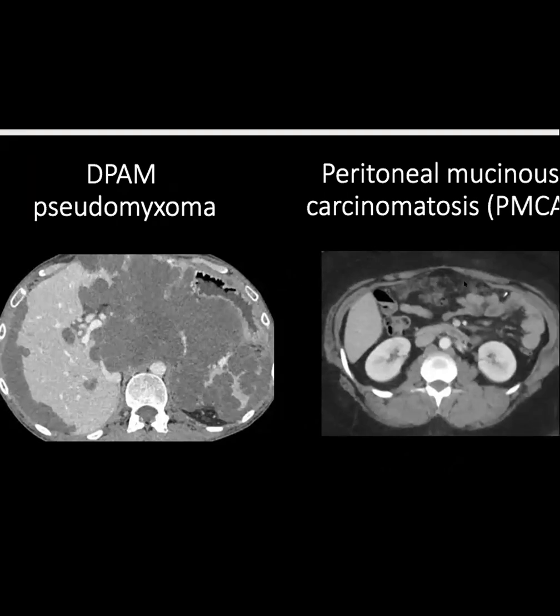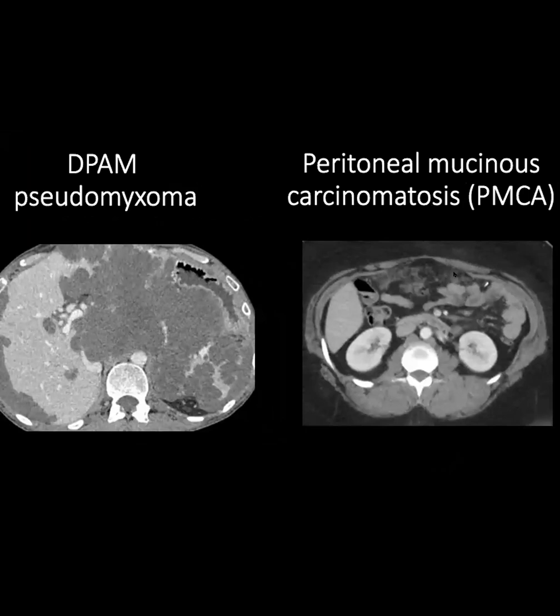Exactly. So I do think that it probably ruptured, but instead of just mucin filling the abdomen, it's actually peritoneal. These are actual tumor cells. It's much more cellular, so you'll see actual adenocarcinoma here. It's not just ruptured and making mucin. It's now spreading like this. And this actually has a much higher rate of non-abdominal metastases, so it can become hematogenous. You can get mets above the abdomen and so on.